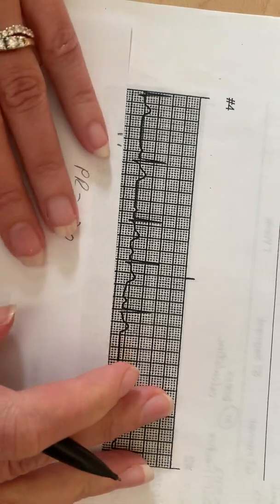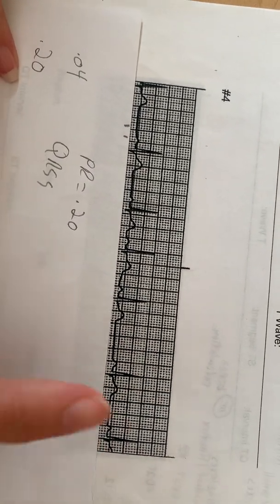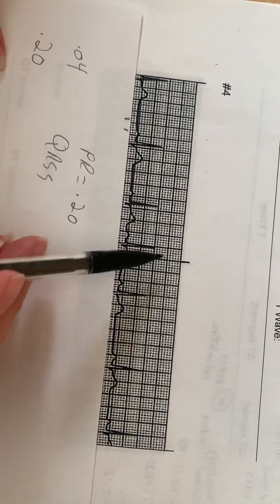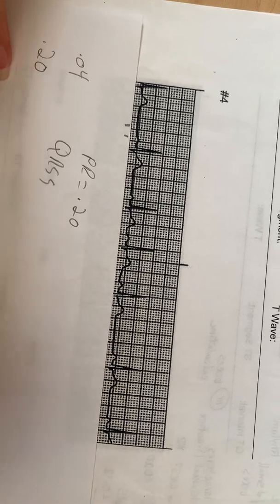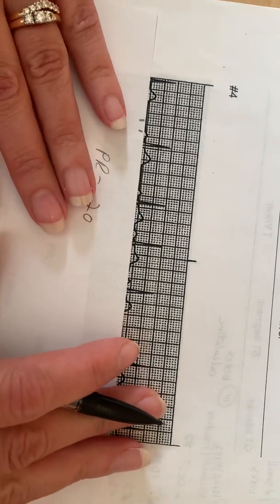I'm going to do the same thing. Now, measuring the QRS is really almost an academic discussion. The thing that you needed to know was, is your QRS wide or narrow? When you look at this QRS, you can already tell that it is narrow, which is really the only question you needed to answer. What you're doing then is deciding how narrow is it.